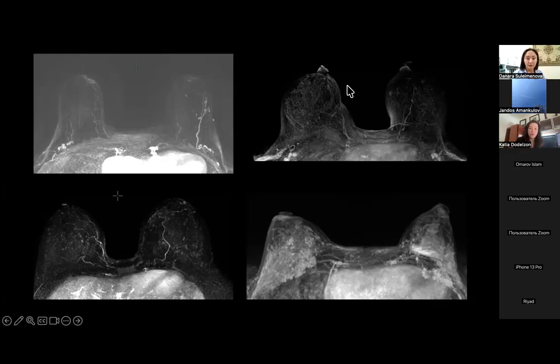And as you look overall at this breast, there's very little enhancement. So this is minimal, less than 25%. This is more scattered. This is moderate. And this is basically all of her breasts bilaterally enhanced. Also notice, and we'll talk about that later, there is symmetry to her background parenchymal enhancement. Both breasts enhance symmetrically. That is a sign of benignity.